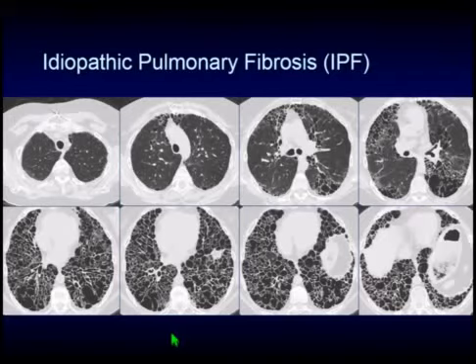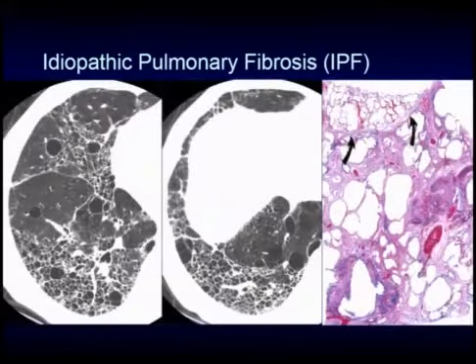And honeycombing, if there's nothing else that you take away from this session, is characterized by these thick-walled, polygonal, hexagonal structures, but within the actual center of that is air density, not gray lung, but really black air density that's similar to the air that's, for instance, within the trachea or the larger bronchi. And that's really the true definition of radiographic honeycombing.